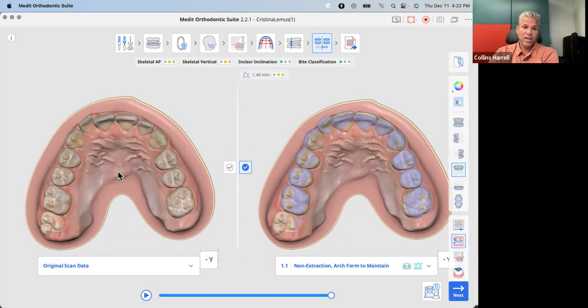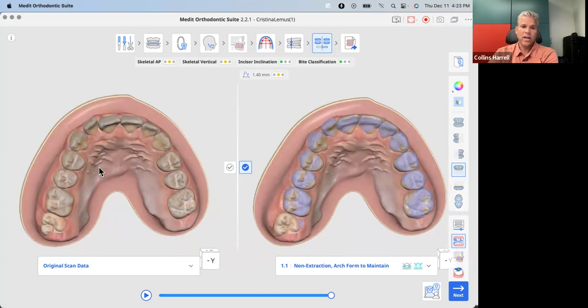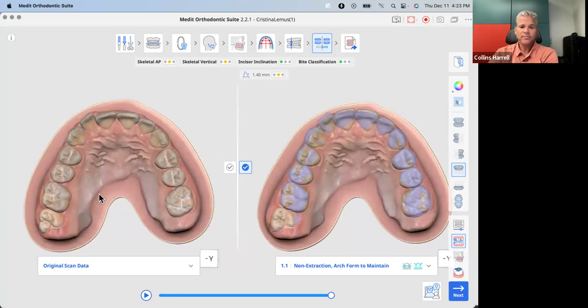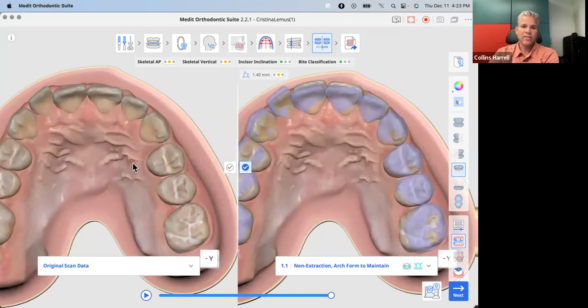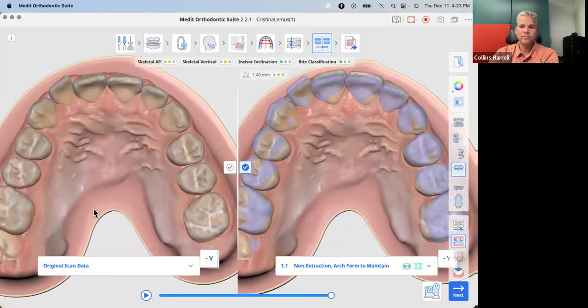If it doesn't benefit the patient in this case, then you either have to distalize with the aligners in the upper right, or you're going to have to do IPR only in the upper right to try to keep it from shifting. So it'd be interesting to see in your progressive aligner setup, if they did not shift the upper midline, you should look at the setup and go, what did they do to not shift the upper midline? Was it distalization or was it IPR on that arch? And you can even see that there's some space on the upper left and there's crowding on the upper right. And so it makes sense that things are shifting to the left side.